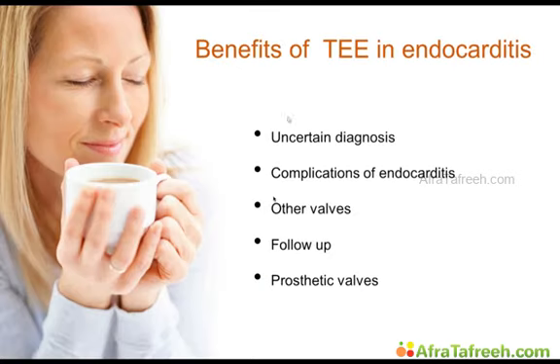Let me show you again some benefits of TEE in endocarditis. First of all, if the diagnosis is uncertain, in this case it was not uncertain, but still, you might not be so sure, then you do a TEE. If you want to see complications of endocarditis, if you want to see if other valves, for example, the mitral or tricuspid valve, also have a vegetation, we've seen that. We've seen multi-valve endocarditis in patients. Then it is also a good idea to do a TEE.